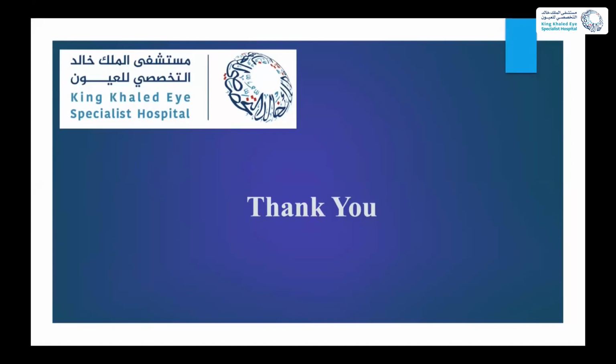Yeah, OCTA will help a lot, and I agree with you, and it will show us where the exact ischemia is. But I know OCT angiography is present only maybe here in Kekish and the university.